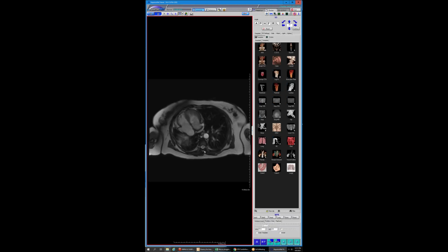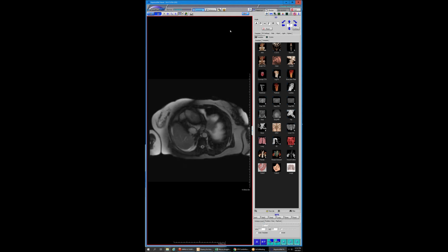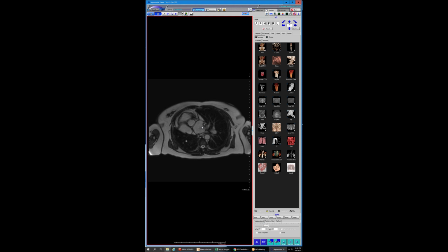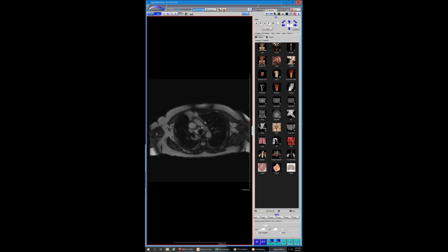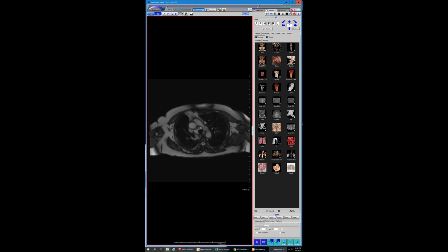I don't know what other people's experiences are on these cases. Of course, we see them in younger patients who have significant shunting, but have you noticed that compression of the anomalous pulmonary vein at the IVC, and if you've seen that more in the older asymptomatic patients? But Seth, the other thing that could be operating here is when that lung is so maldeveloped that it's this small, there's not a lot of blood going to it anyway, and so in a way there's not a lot of blood that needs to be shunted.